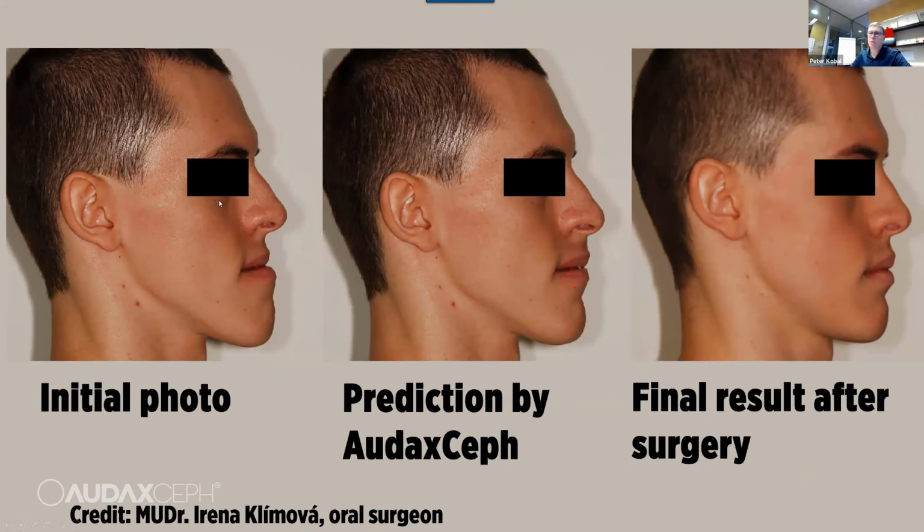And we have here the initial photo. Then we have the prediction done by AudaxCeph, which is really cool. And we have here the final result. So the surgeon took a photo, and this is the final result. Of course, what we have is a possibility to change the profile manually. Computer will do the calculation, but tissue acts in a different way. I'm sure you know what I'm talking about. So you need to be cautious.